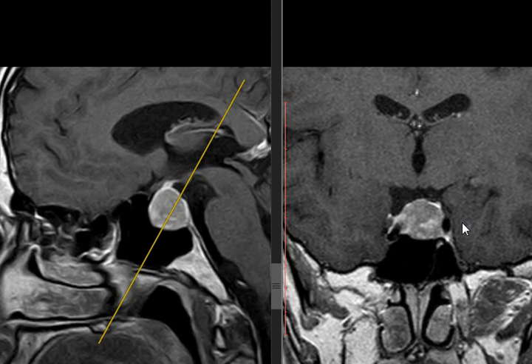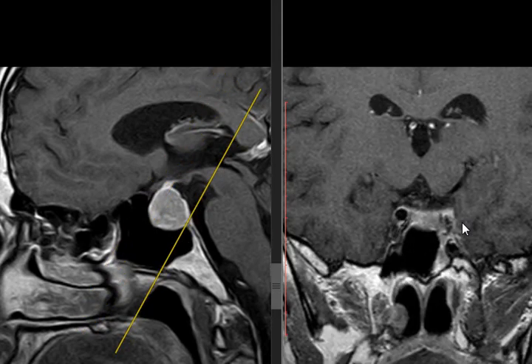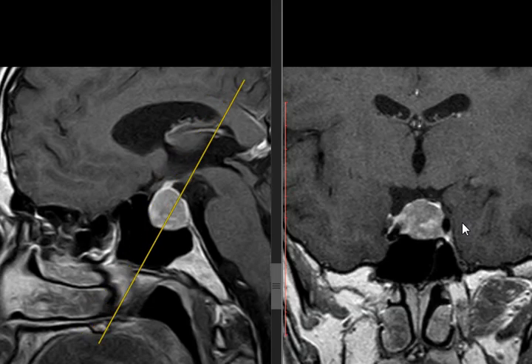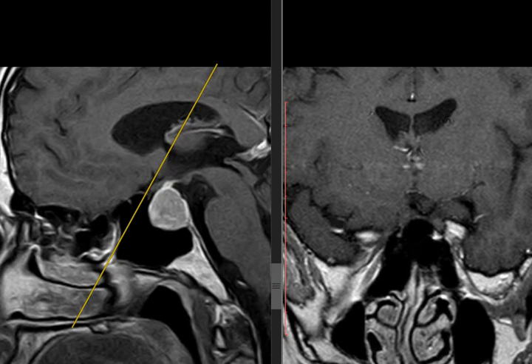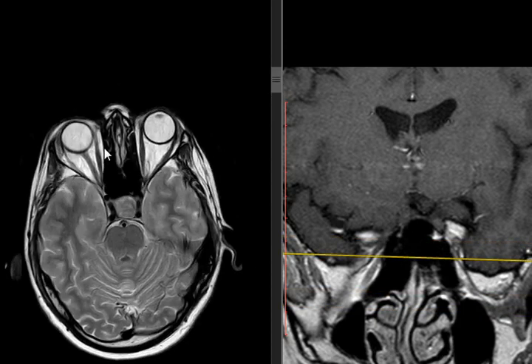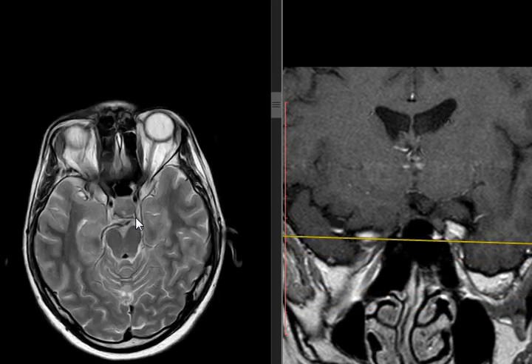Optic nerve glioma? The age of the patient, we said, is 23 years. Anyway, optic nerve glioma is usually part of neurofibromatosis, of which we don't have any evidence. And in the axial, the optic nerve was basically normal. Let's see, where is it? This is the axial. The optic nerve looks quite good here and here. So it cannot be an optic nerve glioma. So this is a very straightforward case of pituitary macroadenoma.